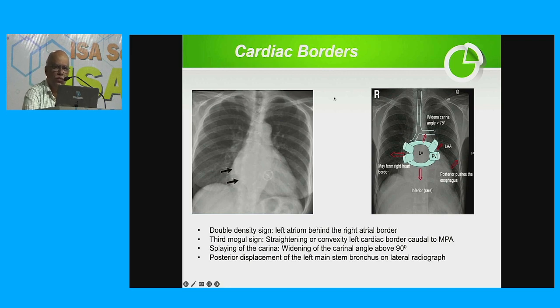So the left atrium can enlarge upwards, downwards, sideways. The carinal angle can be widened. Special X-rays, like barium swallow X-rays, can be taken to delineate these features. So this is a very common clinical as well as exam-oriented question. What are the features of left atrial enlargement in a chest X-ray PA view? The answer should be at your fingertips.